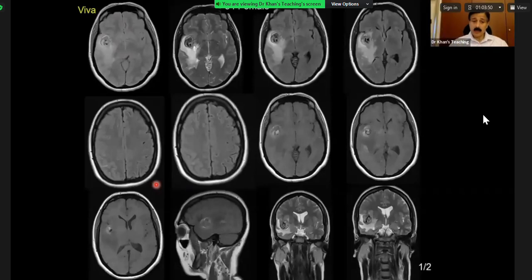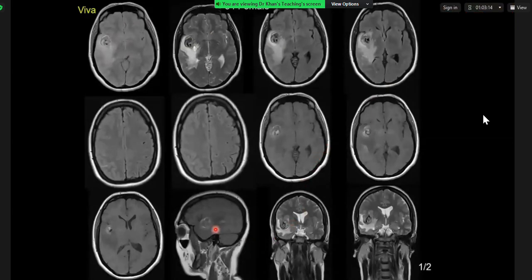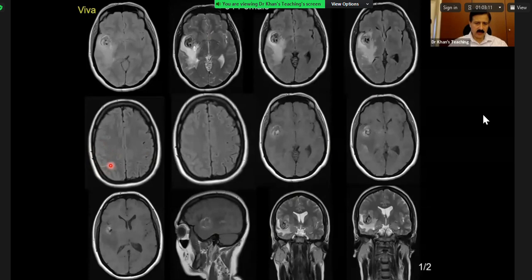Okay. You see, this is a case of cavernomas, DVAs, they will not cause this kind of edema. This high signal within the sulcus is subarachnoid hemorrhage. And you have seen this kind of case initially. Can you imagine this is only 34 years old and this is a giant aneurysm. And this is the bifurcation of the MCA with bizarre signals inside. And then this edema, but I wanted you to particularly concentrate here.